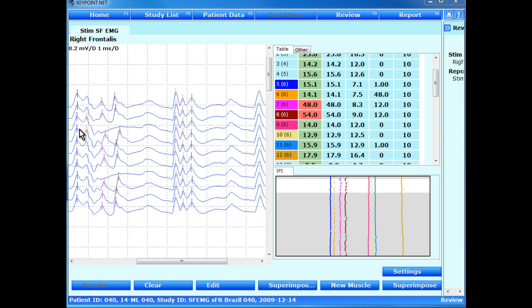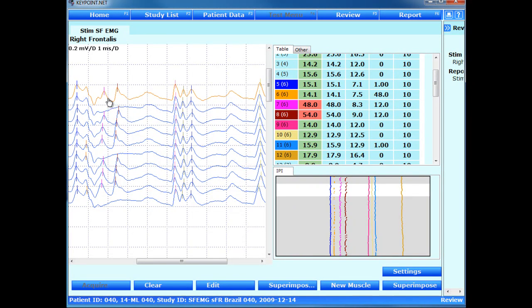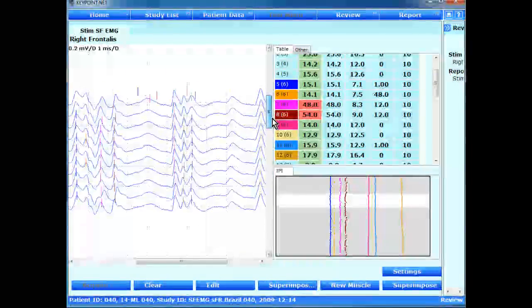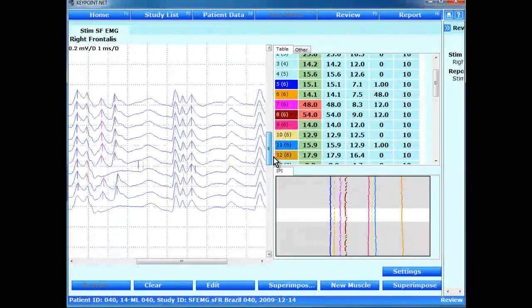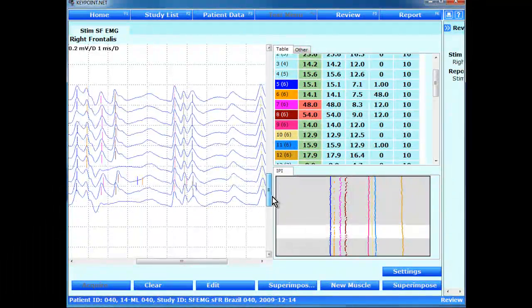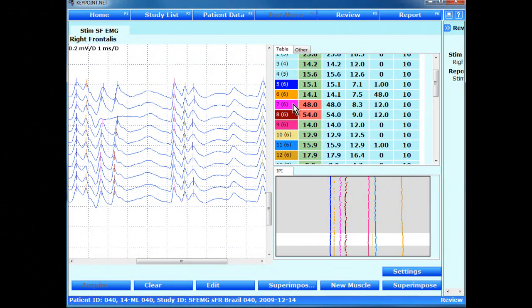Here's another recording with really many spikes. However, they are well separated, and this is the beauty with the facial muscles, even in normal subjects. You can see that there is blocking here in these two components, and when they block, they always block together. So this is not like in myasthenia, where one component blocks separately from the other. So I'm pretty sure that this is a subliminal stimulation. Theoretically it can also be a neurogenic blocking, so-called concomitant blocking, but an insufficient stimulation. And if we had kept it, it should have shown a jitter of 48 and 54 respectively.